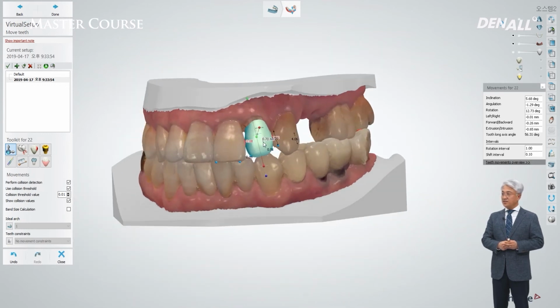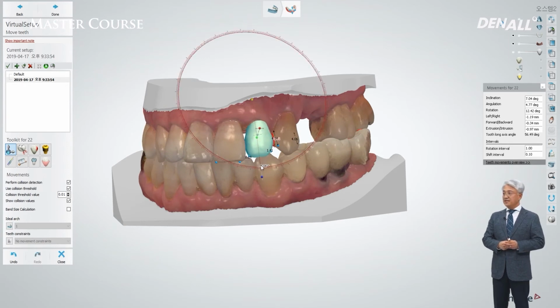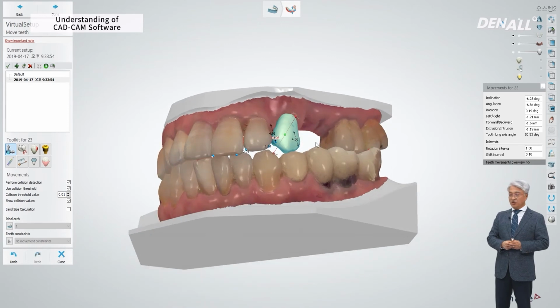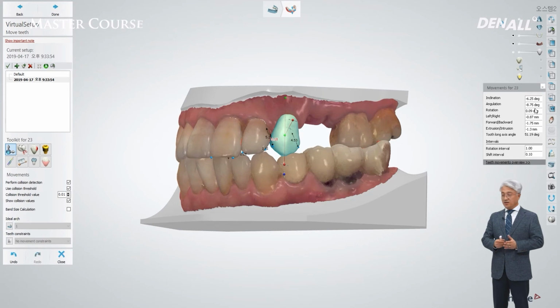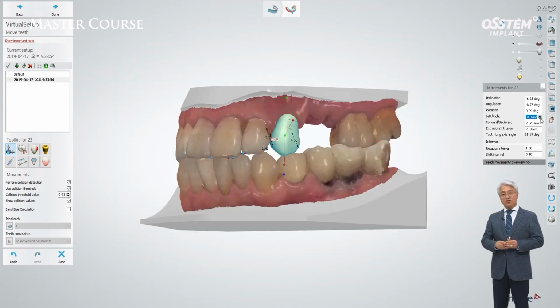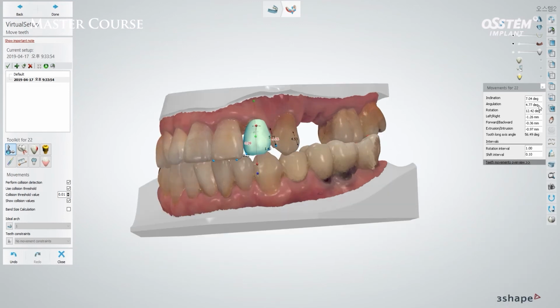In number 22 and number 23, I wanted to adjust it so that the patient had ideal occlusion, and this was the proposal I made to the patient, and the patient agreed. Rather than pushing ahead in a traditional way, I set up the orthodontic treatment first, and once orthodontic treatment is over, in line with the space that has been secured, implant placement will be done as shown. Before orthodontic treatment and implant treatment, by having this set up stage, I attempted to plan the implant.